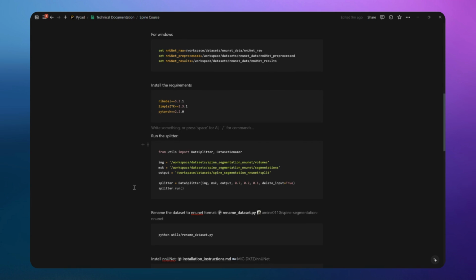The dataset that I have has only 2 folders: one folder which is the volumes and one folder which is the segmentations. To train the model of a UNet, we will need a specific structure, which is the image training, label training, image testing, and label testing, or maybe the label testing we can put directly with the folder of the image testing. Sorry. So you should have at least 3 folders: one for the images of the training, one for the labels of the training, and one that contains labels and images for the testing. This is at least what you need to have.